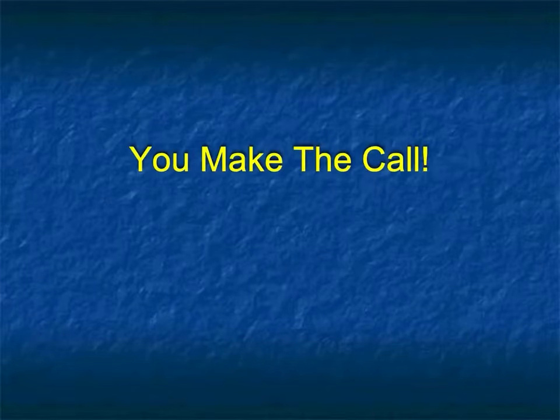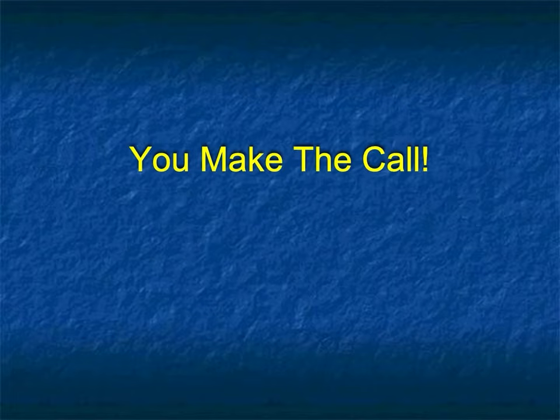Okay, time for You Make the Call. This is where I show you one slide with two images, and we discuss what this likely is, and then we look at the answer and we see how well we did. So again, it's a challenge because you only will see two images, and I apologize, there's a little bit of history, but I want to leave it where you think about the case.